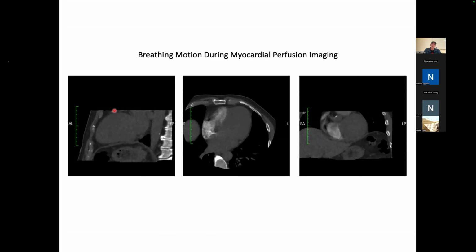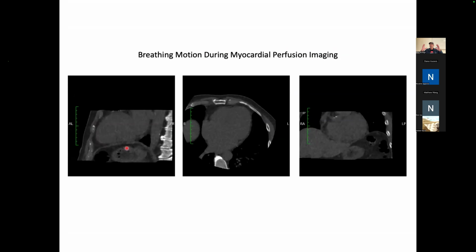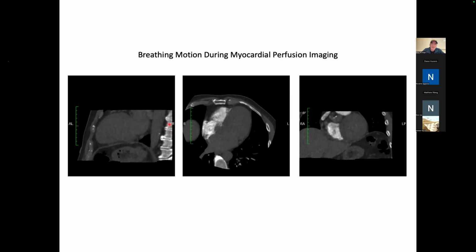And so now you see the heart basically is in the same position for every one of those 25 time frames. The images themselves had to be distorted by not just a rigid, but a non-rigid deformation to try and map everything on top of everything else. And you can see sometimes the spine gets completely moved away because it's not in the control zone.